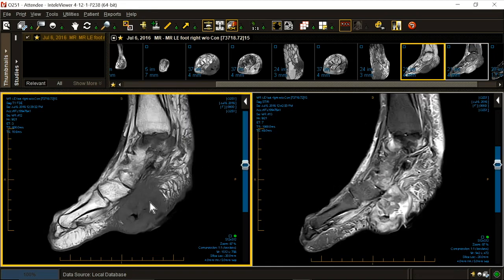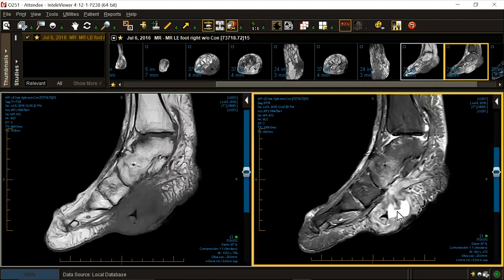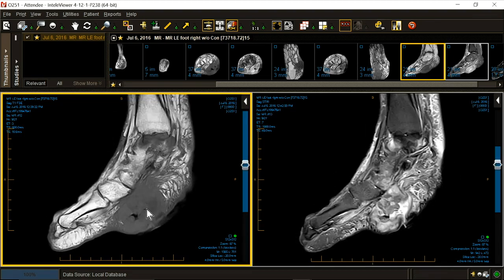There's a massive confluent ulcer. What's in the ulcer? Proteinaceous fluid. So if you perform a diffusion image on this, it'll diffusion restrict. It's an abscess. If you did spectroscopy, it would show a glutamate peak, would show a lactate peak. You don't need that.